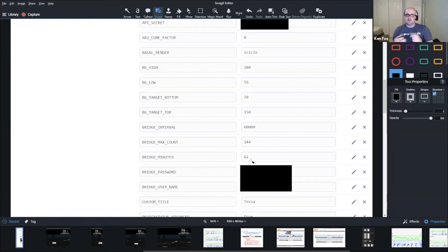So once you do get all those uploaded, it'll backfill all those dots. I think by default, Nightscout only backfills a couple of dots. So this is a little extreme, but 144, I think, is 12 hours? Or is it how many readings you have in a day? I can't remember. But there you go.